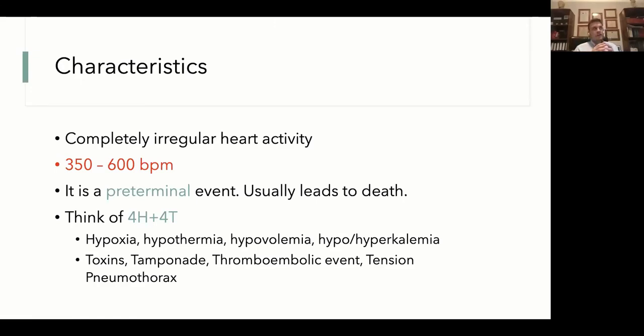So for a patient having this, actually, tell me, is this rhythm a shockable one? The ones that have passed first aid. Ventricular fibrillation, is it a shockable or non-shockable rhythm? Do we use electricity to return the patient back to normal rhythm? Shockable. It is shockable, yes, it is shockable. This is why we care, okay?